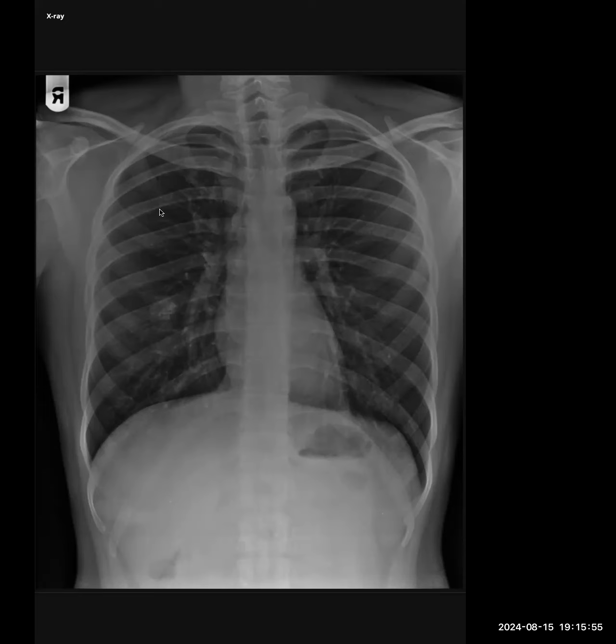So in this case, in the first part of your description, you did not think of something that could arise from the chest wall, and that is okay. That's not something that pops up in our mind immediately. We always think about hamartoma first when we see something like this. But then you started going towards hamartoma, granuloma. Those are honestly the two differentials here. It's very less likely to be any kind of cancer, but those are the top 3. You can't really think about anything else unless you are thinking about a chest wall lesion, which you can definitely add. So that's the general piece of advice.